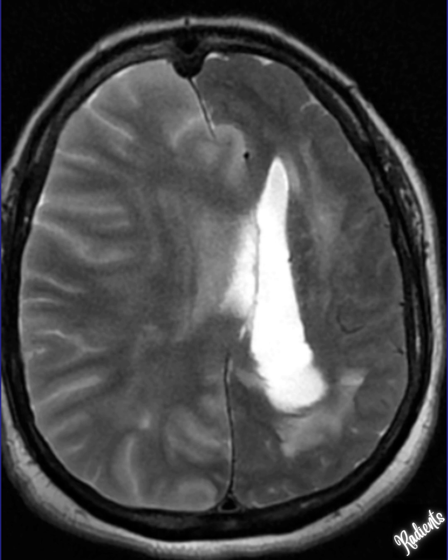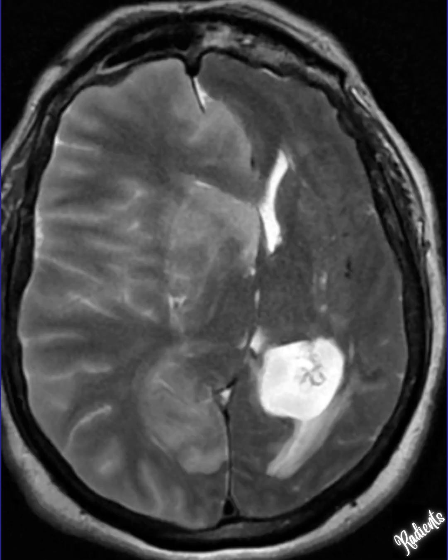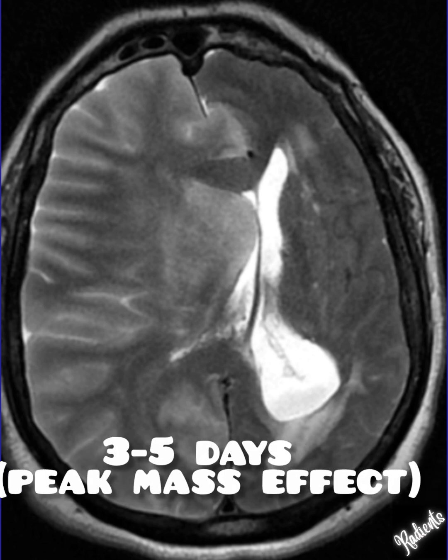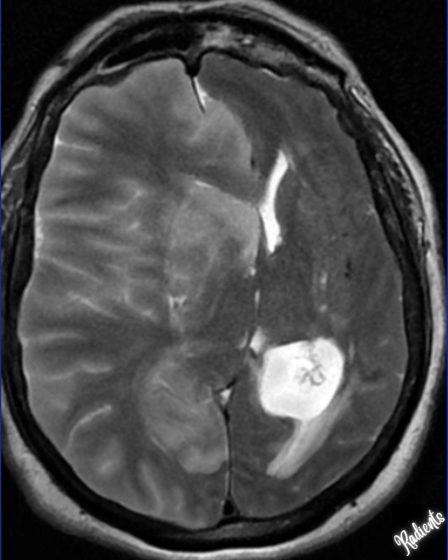mass effect and edema, which tells us that because of this significant mass effect, we can say that the infarct might be around 3 to 5 days old, because that is the period when the mass effect is at peak. So this should be either an acute or an early subacute infarct.